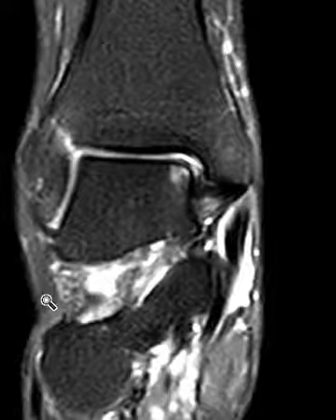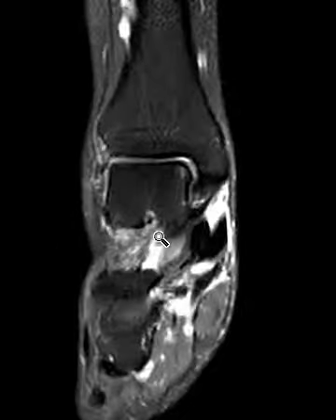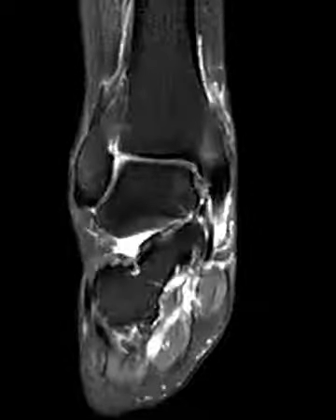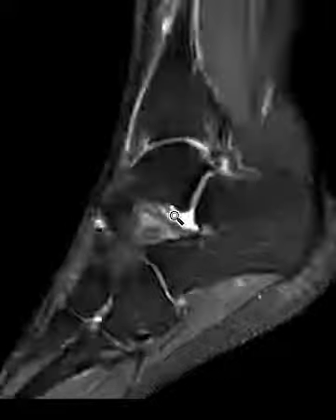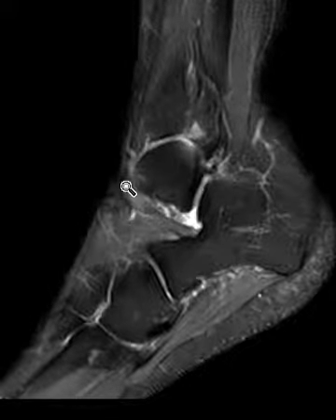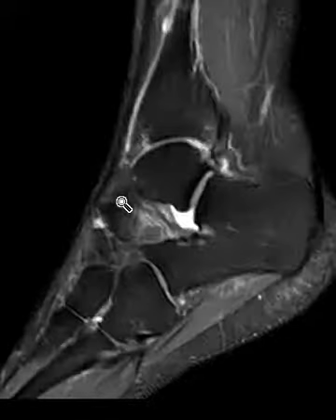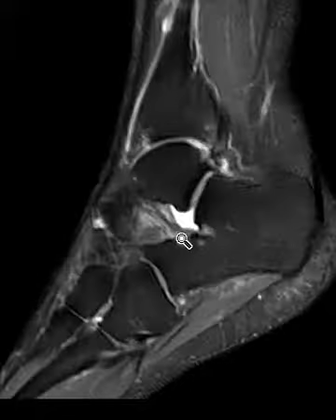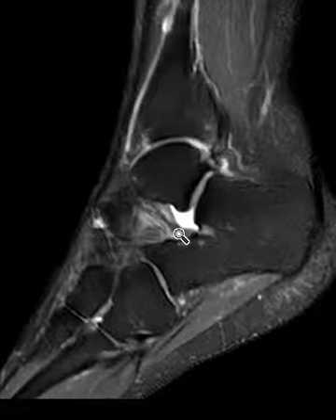And also in this, we notice this fogginess here. This is within the sinus tarsi. We want to look in the sinus tarsi. Now in the sinus tarsi, it's right in this region here. We see some ligaments. Just to go over these again, along the superficial aspect anteriorly, we see the inferior extensor retinaculum here. Some of the superficial fibers come down across the sinus tarsi here.